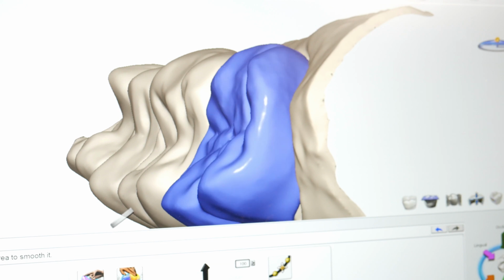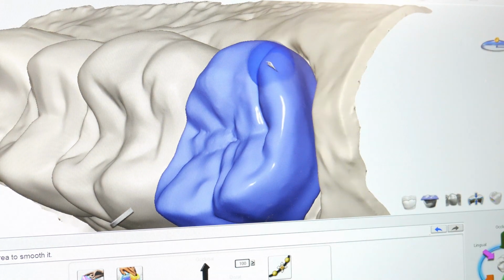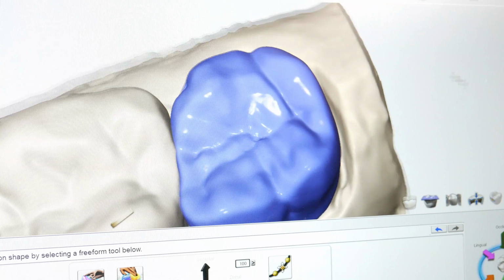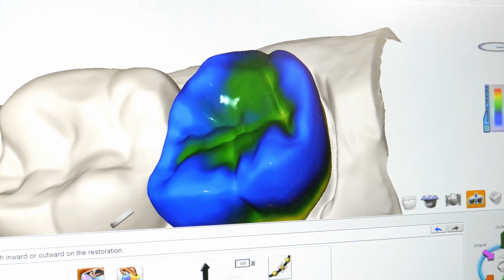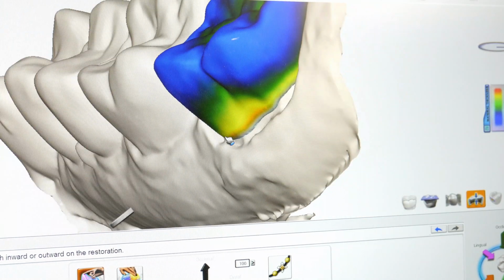I'm going to kind of soften how pointy that distal lingual cusp is. It's a bit too much. There we go. Kind of smoothing off that distal there. It was a bit, there we go, a little more squared off, broaden. Okay, so thickness first. Just getting that.